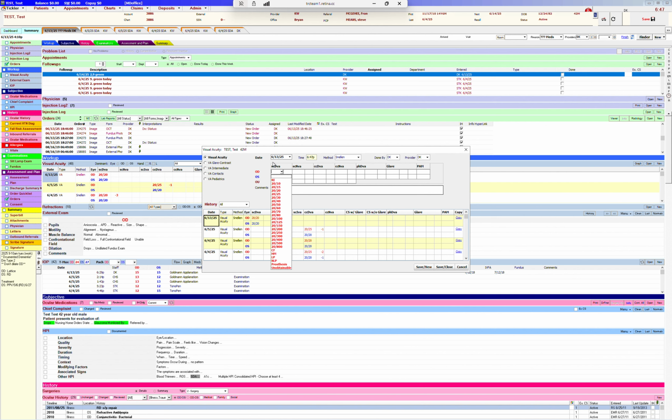Now, across the top of this box, we want to say visual acuity, and Snellen here will default, and that's appropriate. Now, if they are not using their glasses, you go SC, without correction, distance visual acuity. If they are using their glasses, you'll go over here to CC, with glasses, distance visual acuity. We very rarely test anything else, so these are the two lines that you will be using.